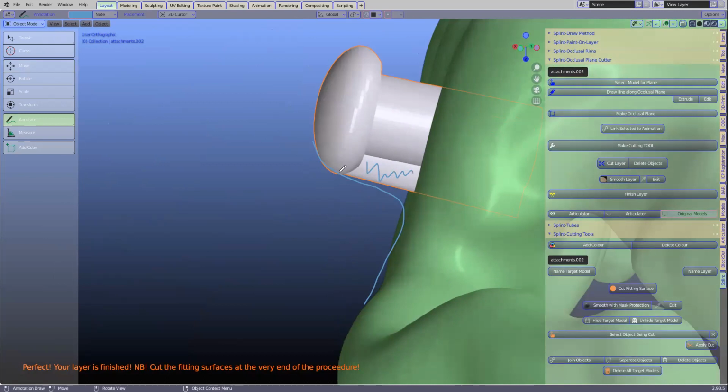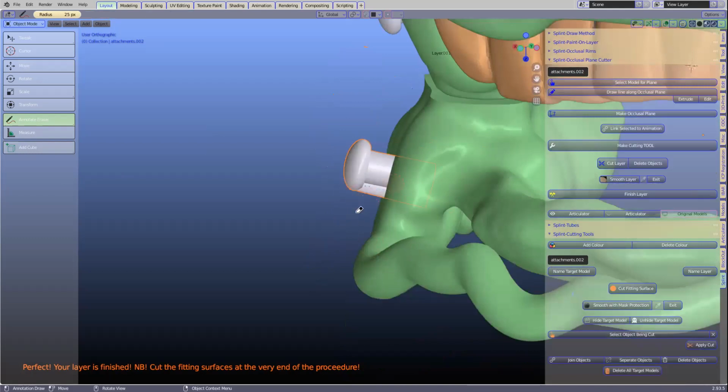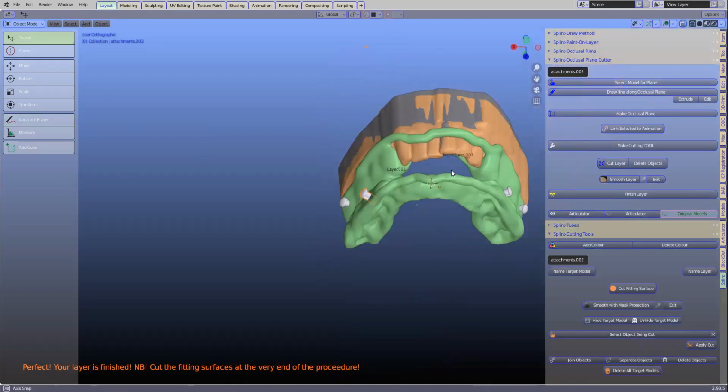That's correct. If that wasn't there, you'd have to put a support here, wouldn't you? Yeah, you've got to think about all these little things. And the elastic loop will go over that and hold it tight anyway. So it doesn't matter if there's a little ledge there.